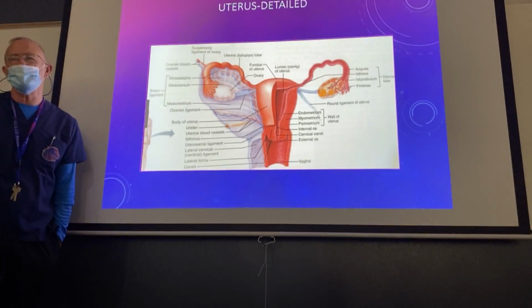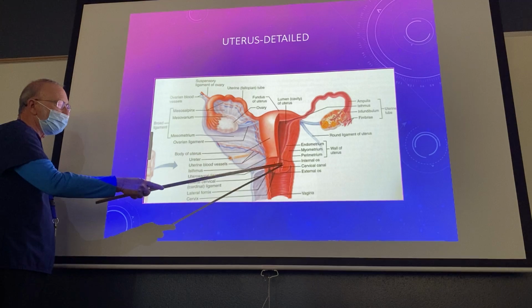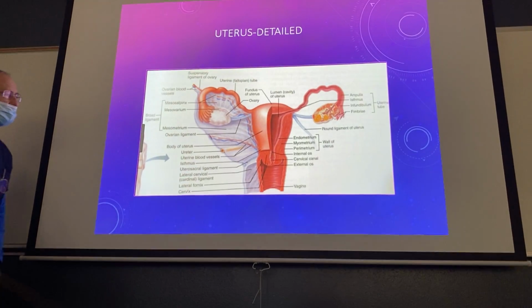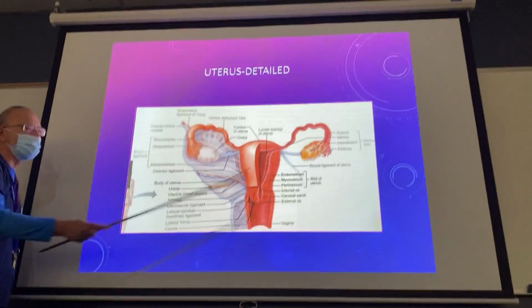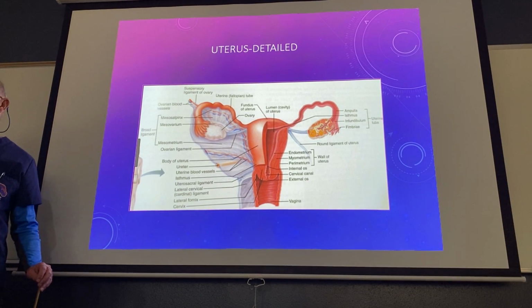Going to run posterior to the bladder, and then the cervix would be the lower portion. It's hard from our standpoint on CT; ultrasound is a lot easier to distinguish between the body and the cervix. In terms of what we used to call fallopian tubes, now in Gray's Anatomy, they call it the uterine tubes. So that's the new term for it.